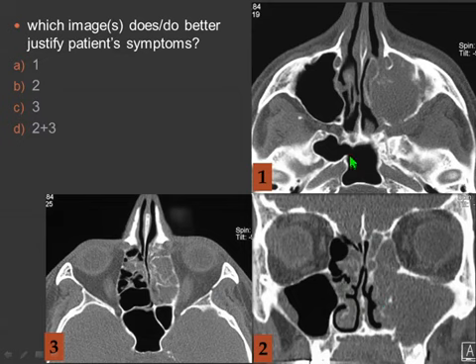I think that the most important is the axial plane. Why? We have to check, but mostly because of the change in the soft tissue behind the posterolateral maxillary sinus wall, and also because of the thickening and a more sclerotic change in the pterygoid process root, as you can see at this level.